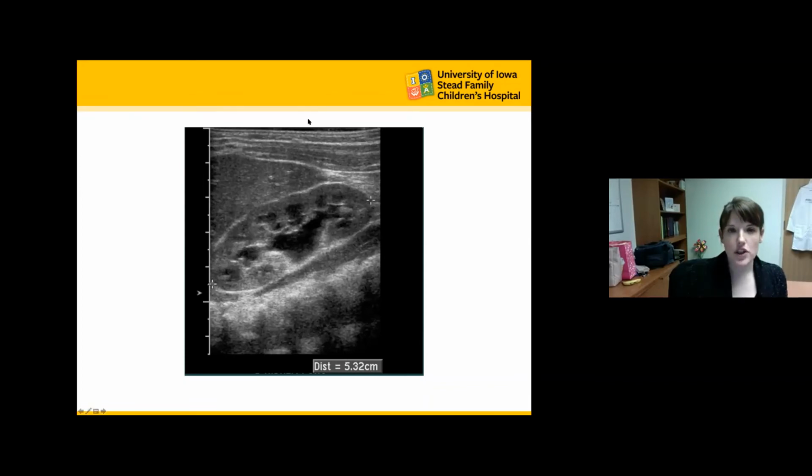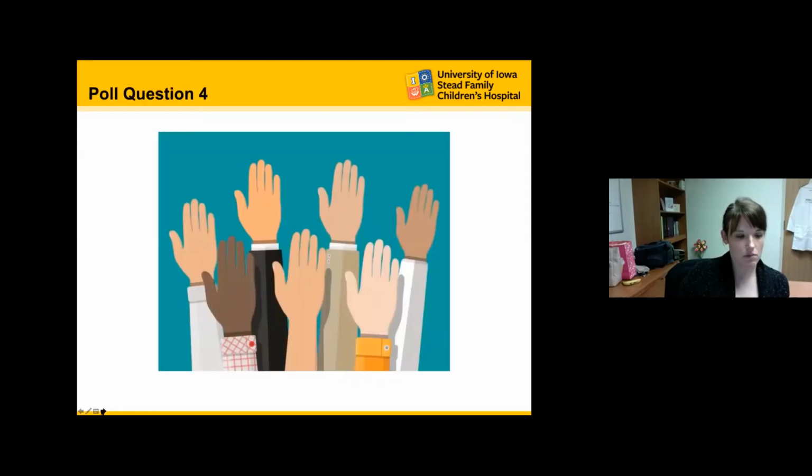Yeah, so I would call this SFU grade 2, and this is what it was listed as on the website. We'll go to the next slide, which defines things a little bit differently. The important things to note in this ultrasound are that the renal pelvis appears to be dilated here, extending out to the major calyces that stop here. What you're likely seeing out here in the periphery, which can be easily confused with peripheral calyceal dilatation, is normal renal pyramids.